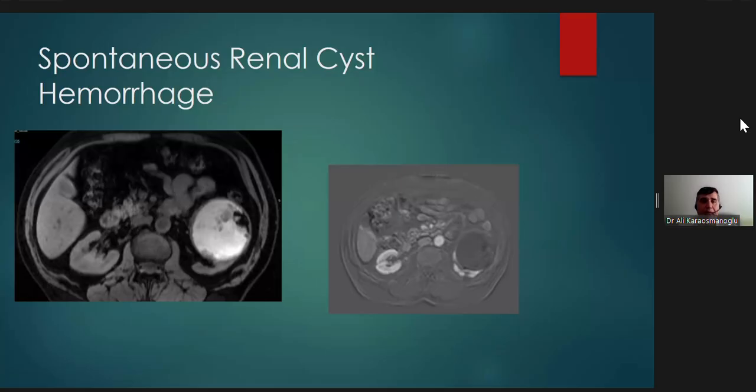So always consider that. This patient, again, presented to the urology clinic with mild, vague left flank pain and hematuria. Hematuria was the leading finding. On ultrasound, we saw a large mass. It was not a cyst, but there was no flow on color Doppler examination. So we did an MRI. On pre-contrast T1, you see a mostly T1 hyperintense lesion with suggestion of papillary areas in the wall and hypointense areas.